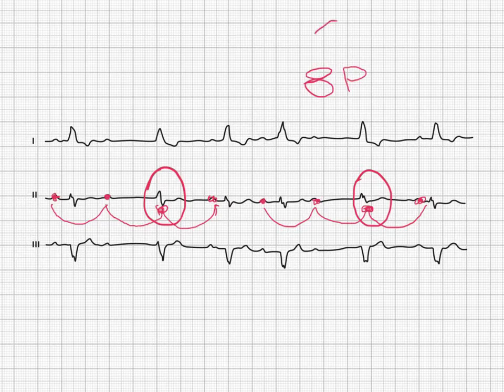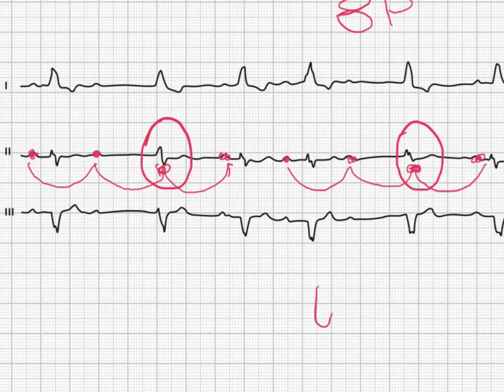have 6 QRS complexes. This P to R ratio allows us to make the diagnosis of high-degree AV block, and since the QRS complexes are irregular, we should end up with a diagnosis of a Wenckebach phenomenon. Well, we know that in Wenckebach we should have a gradual increase of the PR interval until finally one of the P's is blocked. Well, how is this here?